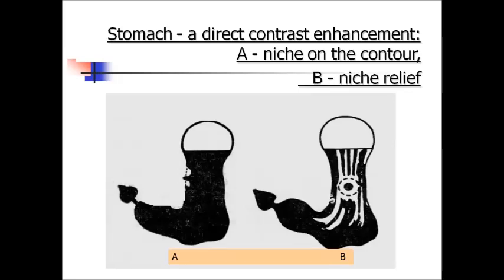First pathology which we will observe is ulcer of stomach. This defect, ulcer defect with barium study will be contrasted directly by barium sulfate and will show us two symptoms depending on localization of ulcer.